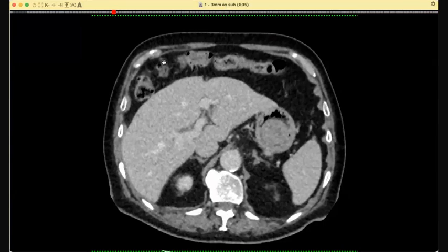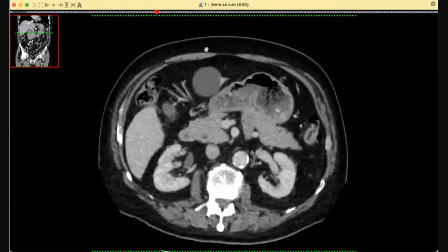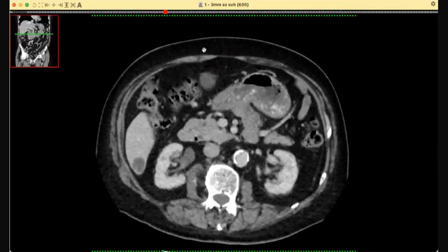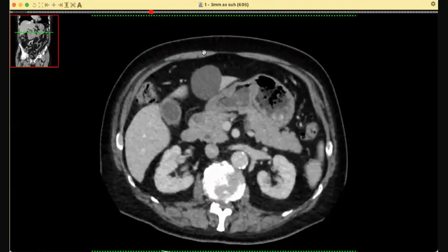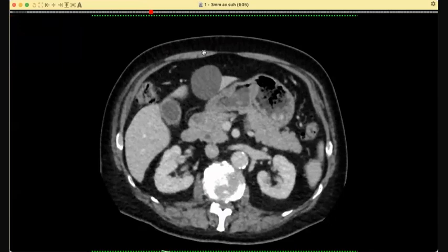Okay. Please can you help me scroll? I've been presented with abdominal... So you have to ask for the mouse. Do you know how to ask for the mouse? Yes, but I'm using a phone, so I can't scroll with the phone. If you are using a phone, you will not be able to do it. You should not be using a phone if you want to be a candidate and you want to scroll. Do you know how to ask for the mouse? No. I think I do. So if you ask, then it will pop up on my screen and I'll give you the permission.